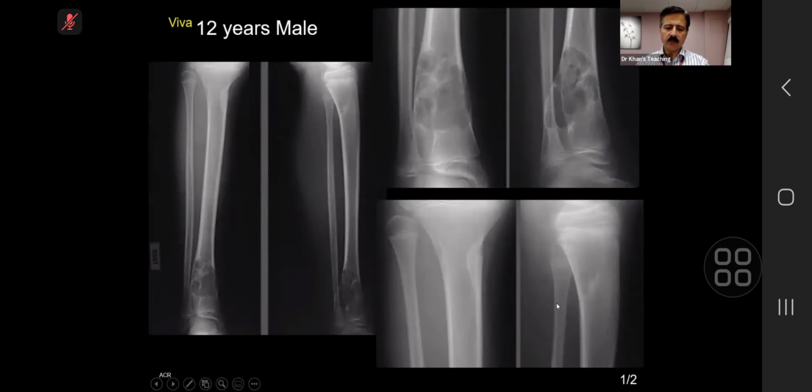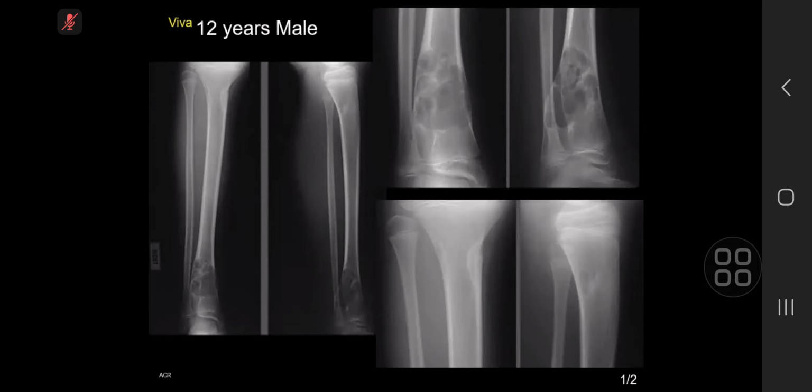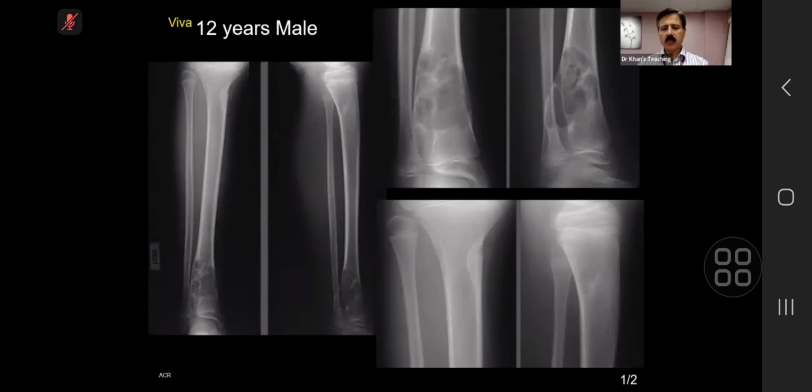So in the proximal tibia, in the proximal metaphysis, I can see another lucent lesion with a sclerotic margin, and again, no surrounding periosteal reaction, no cortical breach. So it has a narrow zone of transition, again a benign lesion, and my differential for this would include a fibrous cortical defect. It's quite eccentric. What is the size cutoff between the two lesions?